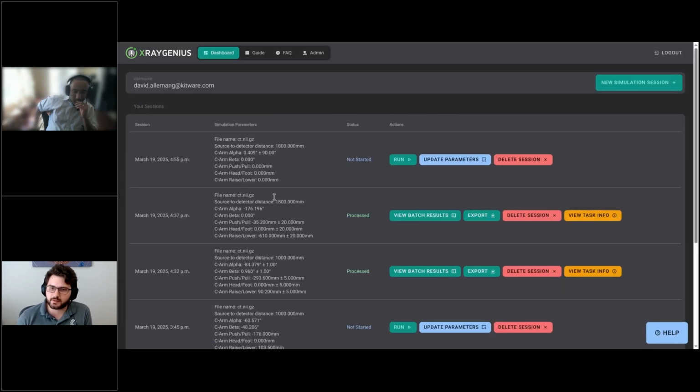it's added that session to my list, and I can run it. I'm hoping that it's fairly quick since we are wrapping up, and I want to leave time for any other questions. But once we get this, we'll have that sequence of images and exact angle annotations for each one that we can feed into our reconstruction process.